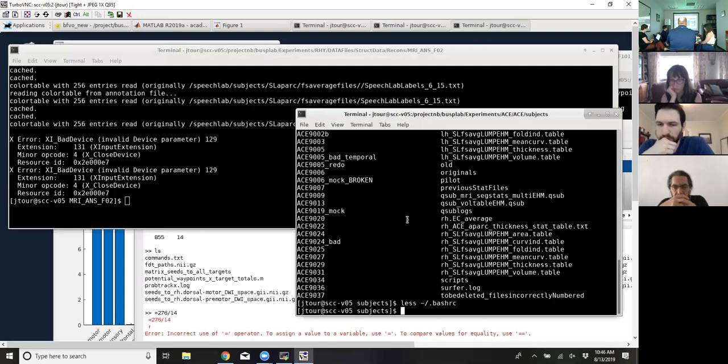To make it easier. So if I did this, if I did SS equal, So Jason, if you have it in your bash RC file, like the subjects dir, and then you write it on the command line, does that override it? If you write it on the command line, it does. So, okay, what I should do now is just in my bash RC file, add this little bit.